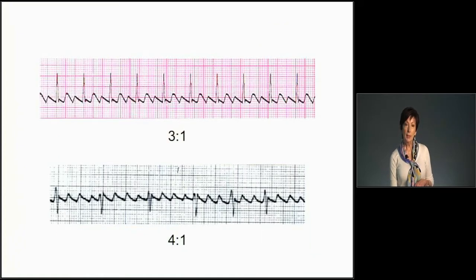All right. Here's an example of 3 to 1. 3 to 1 is not very common. Most of the time, flutter is in a 2 to 1 or a 4 to 1. And then at the bottom, we have 4 to 1.